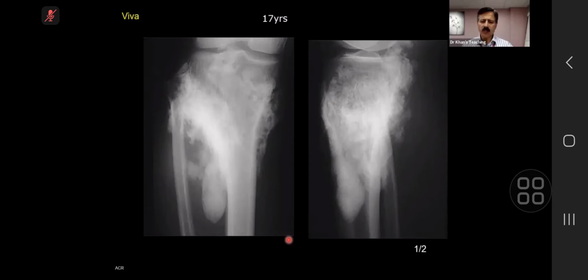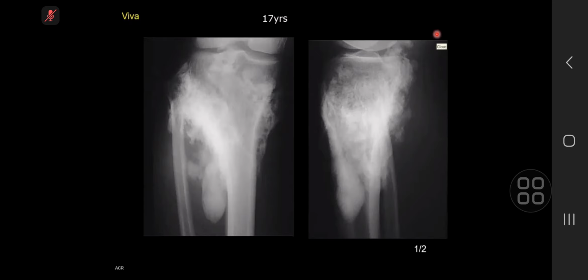Okay, so you described it. Some debate came to your mind as far as chondroid matrix versus osseous matrix. Can you revisit that? What were you considering? Well, just in parts of the lesion. So, for example, on the frontal radiograph, the inferomedial aspect, the calcification appears somewhat septated or ring and arc-like. Mm-hmm. So I just wasn't sure how best to classify this matrix, and if it classifies as one or the other, then we have to consider whether this is a malignancy of chondral origin. Mm-hmm.